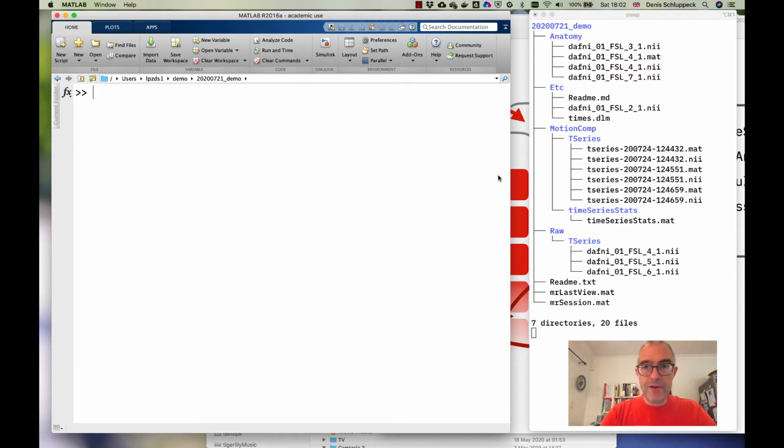In this quick video, I want to dig a little bit deeper into the data structures that are used within mrTools to interact with the data. So once again, I'm in the folder that we've been working on so far, the data set. You can see it's grown a little bit because we've done some additional analysis and so on.